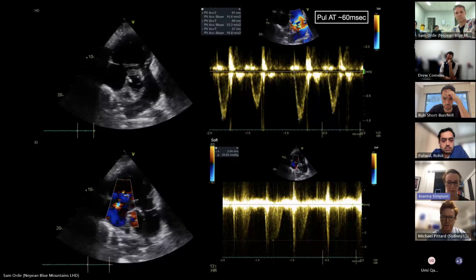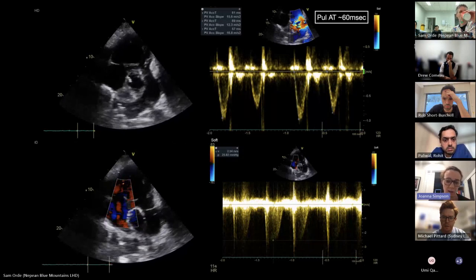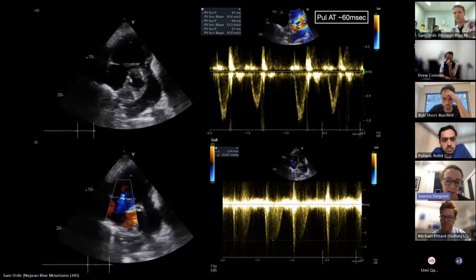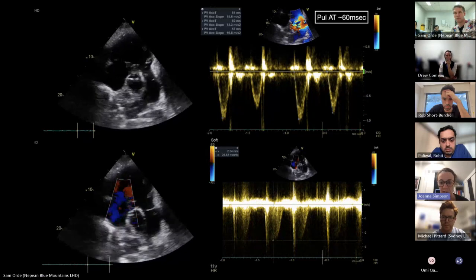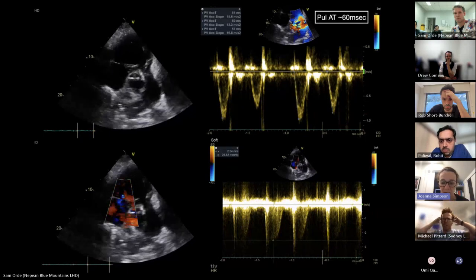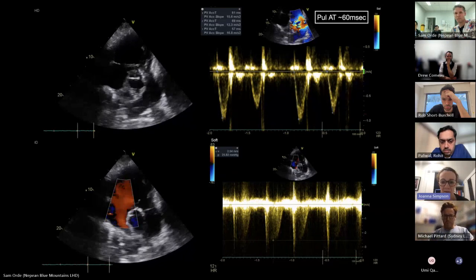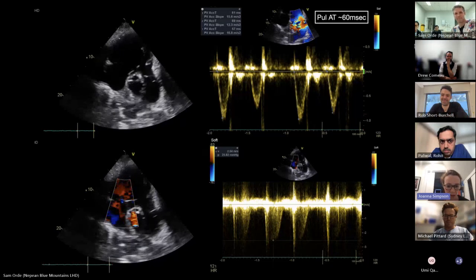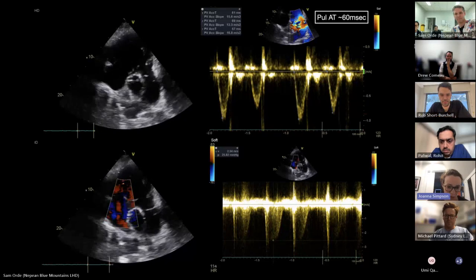All right, so parasternal short axis view, focusing on the RV outflow tract to pulmonary valve, and again significantly dilated RV. That's in the top left, and then on the top right is the pulmonary acceleration time, which is significantly reduced, indicating raised pulmonary vascular resistance. There's no flying W sign there, so that indicates more post-capillary pulmonary hypertension rather than pre-capillary. And then the bottom left shows colour Doppler through the tricuspid valve, and there's some tricuspid regurgitation there.